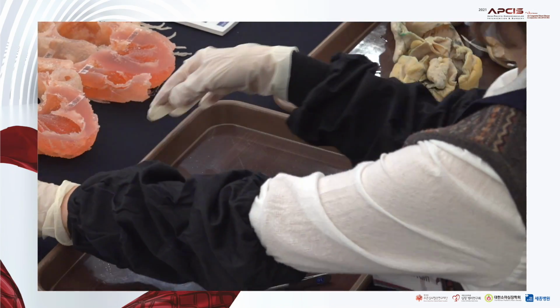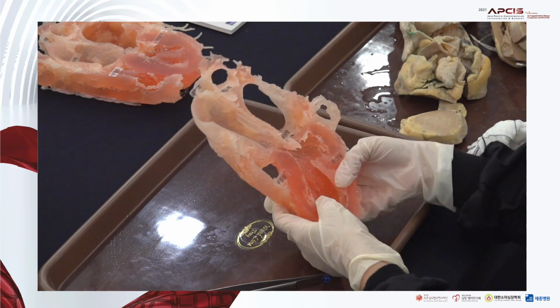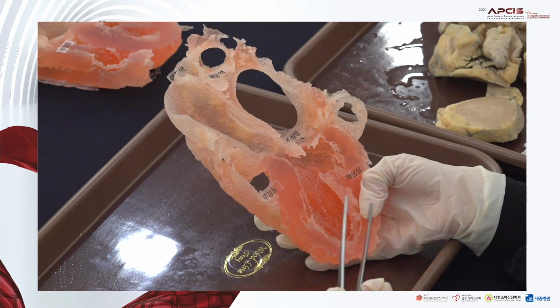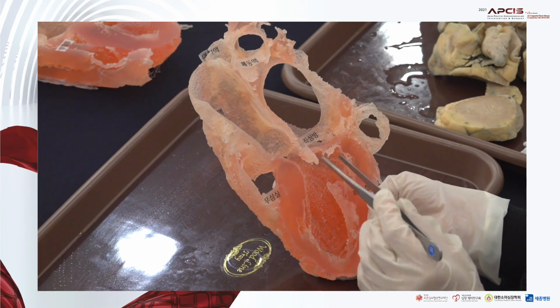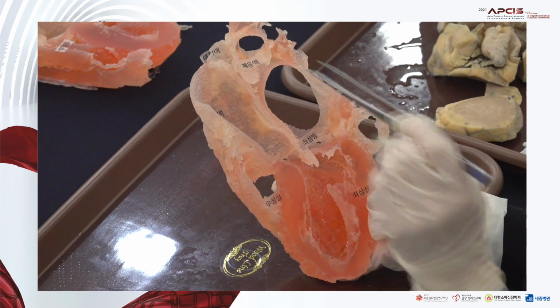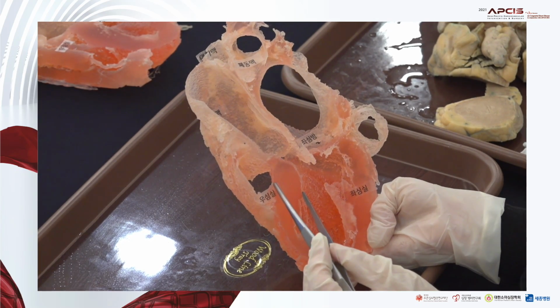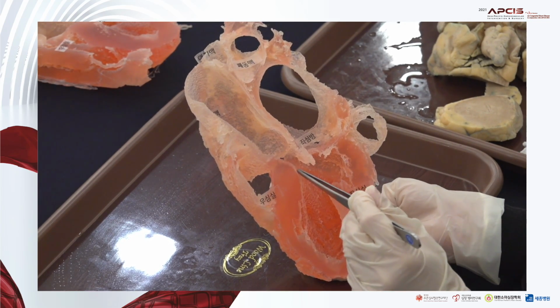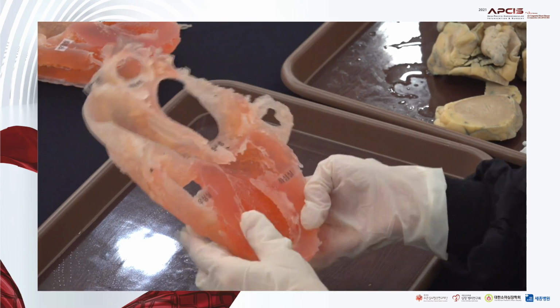In order to emphasize the subaortic outflow portion, I will show you the long axis echo view of the same heart here. So this is the left atrium, left ventricle, and here is the aortic valve, and then aorta. This is diastolic phase. So the left ventricular wall is thick, but still the aortic outflow portion is open.